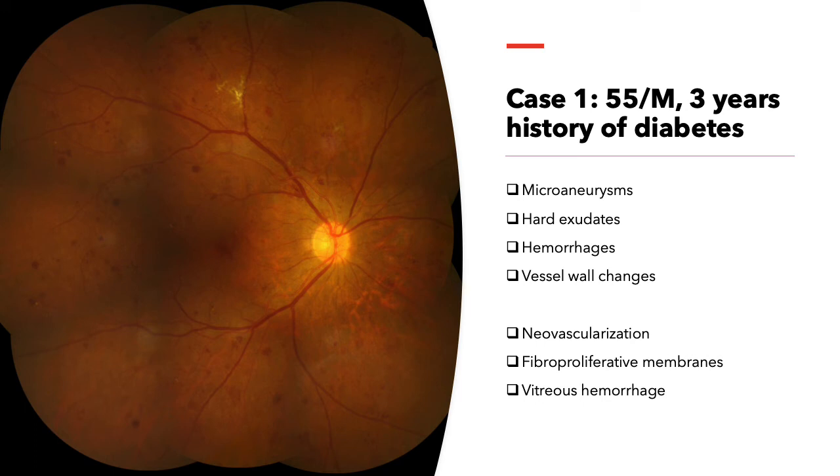Look for microaneurysms. What you can see are really blood hemorrhages. Okay, they're the most prominent one. And then up there you see hard exudates. Okay, meaning there is already leakage happening. So probably the photo is too small. Maybe you can enlarge it. Always enlarge your fundus photos and look for the small dots, which represent your microaneurysms.